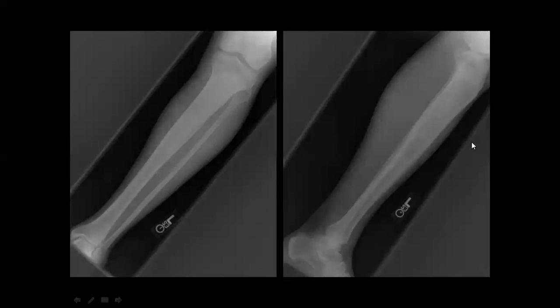And look, periosteal reaction. I didn't agree with periosteal reaction because when you see periosteal reaction, you should see something in this line, which is the periosteum, right? But you don't see any appearance. It looks like the process is here with some expansion. And if you are lucky, you can see maybe some endosteal scalloping here, but it's not very obvious. But yes, you can see something like endosteal scalloping here, right?